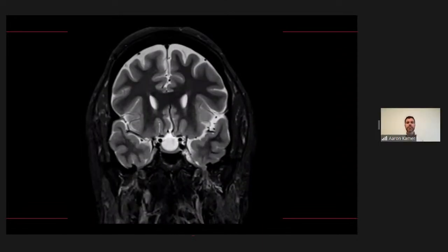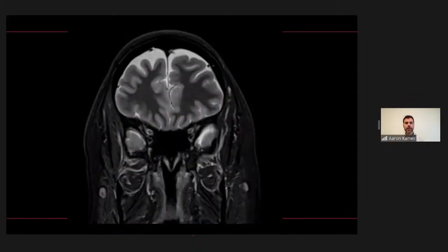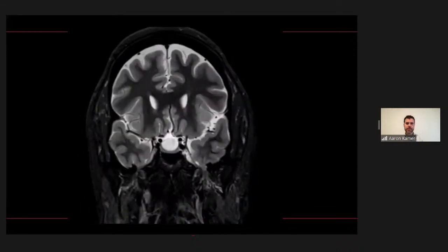Yeah, exactly. So we've got an empty sella here. That's the most obvious abnormality. Okay, but that's probably not causing seizures, obviously. So are you noticing anything else?